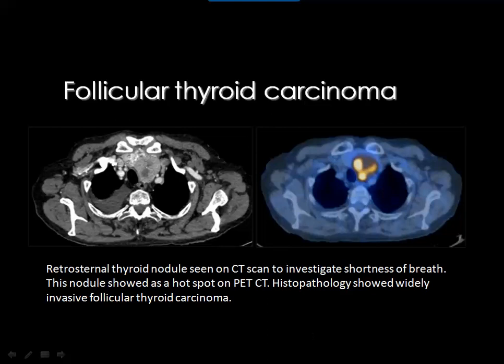The role of PET scan is to show if there are metastatic lesions, for example, in thyroid malignancies. But if you see an increased uptake like this, this will not support the possibility of malignancy, since you may see this uptake in inflammatory lesions as well.